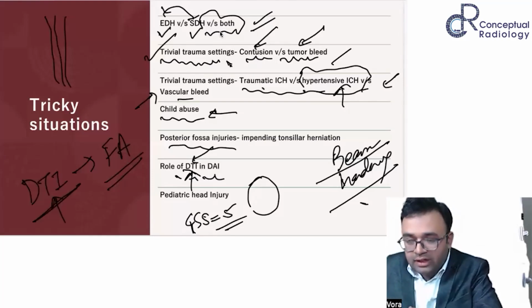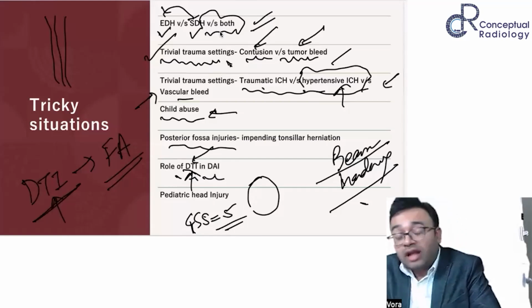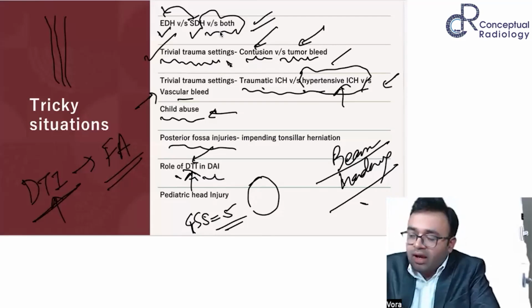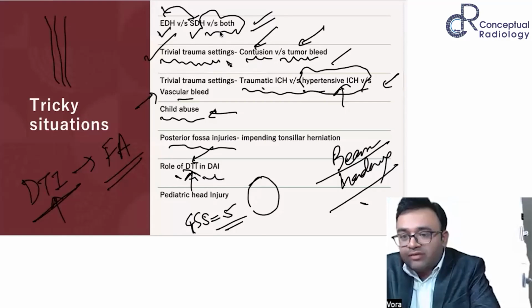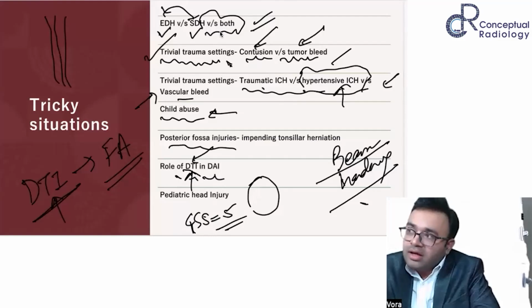But if you see decreased FA on DTI, that is what is tricky. Now, if the tracks are damaged, for blooming, if there are hemorrhages, sometimes you have non-hemorrhagic contusions. When you have non-hemorrhagic contusions, it will not show blooming on GRE. Especially in cases where you have non-hemorrhagic contusion and focal deficits to long tracks, GRE and SWI might turn out to be non-conclusive. In such cases, the relevance of DTI comes in.